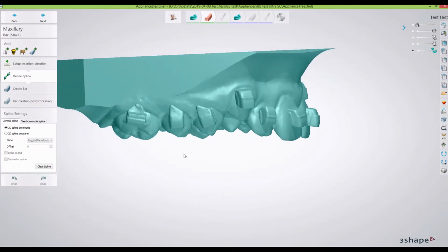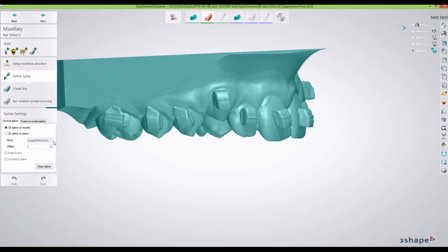Here's where we're going to define where we want our tray to be. We don't have to touch anything here. All we need to do is draw the outline. I like to go slightly distal to the last molar or tooth we're going to be bonding. I also like to imagine where the wings are at. At the molar, we're going to go slightly higher, particularly if you have a bracket that's non-convertible and doesn't have a tie wing. You're going to have to embed that more into the plastic. And then I like to do 2 points on each tooth. In some techniques, if you're creating a shell, you're going to go in between. So if you see that, don't do this. If you want to do it just like we're doing to direct print a tray, just go on the bracket.